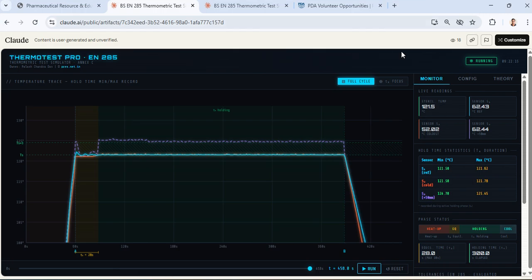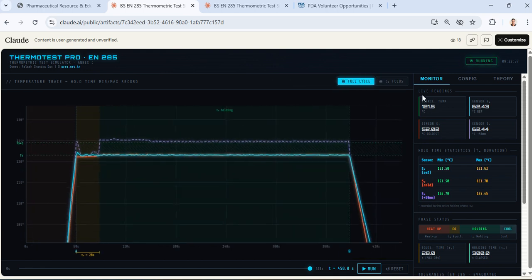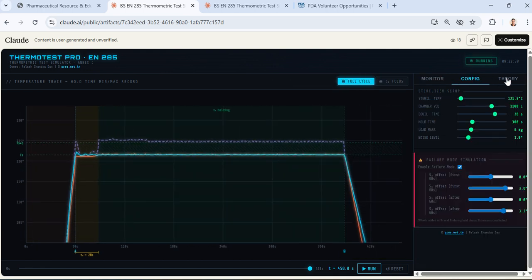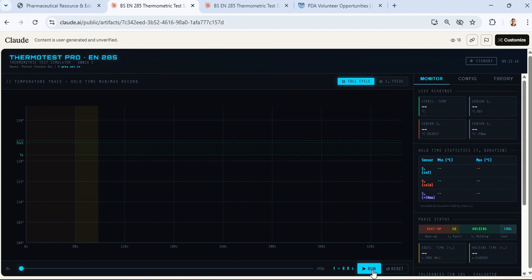I have a couple of questions and clarifications about lag time, but lag time is not really used here. Here we use the equilibration time. So maybe I will come back in a different video where we talk about lag time or other stuff, but this video is very specific to the equilibration time. I think you like this interactive model. You have everything, just play with this, and don't forget, when you use the failure mode you should tick it off, otherwise you will always see a bad cycle.